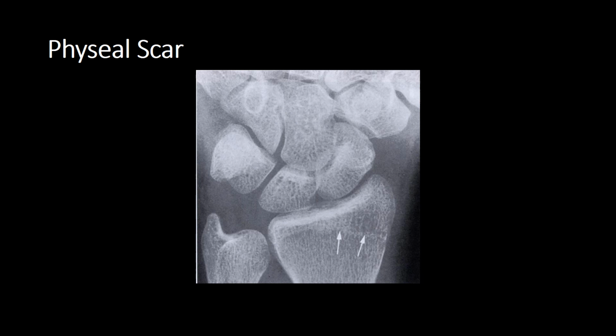The most important thing is to familiarise yourself with their locations and to recognise that these are a normal anatomical variation. To assist you with elderly patients, look for the soft tissue swelling to assist with your diagnosis.